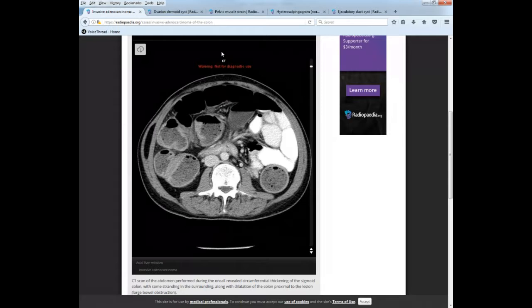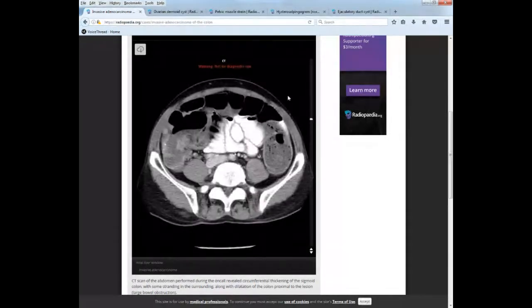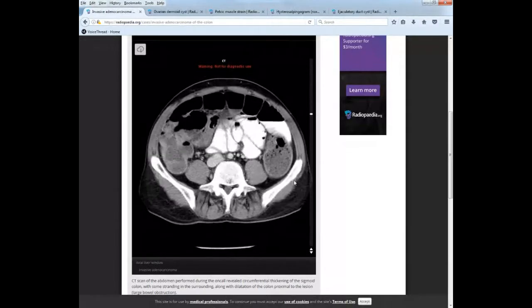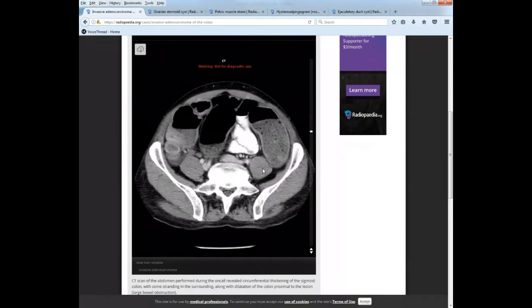So start all the way at the top and start heading down. Okay, now we're looking at muscles in the pelvis. So let's start when the crest starts to come in, okay? So we have crest. First thing we want to identify are the psoas muscles, which should be very easy for you guys right now. Psoas muscles are always going to run lateral to the body of the lumbar spine, okay? So follow your psoas muscles.